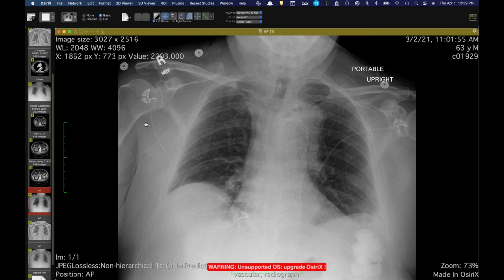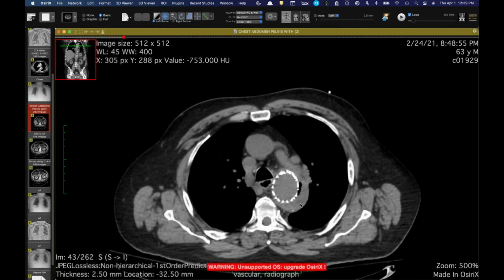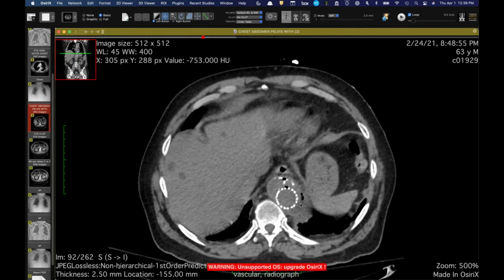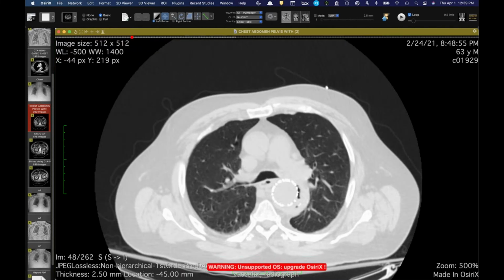And this was the follow-up radiograph, and in between, we did a couple of CTs. But you can see this thing is chronically thrombosed. There was never filling of this false lumen, which is kind of interesting on its own. But they had gotten a good proximal seal. But there's just gas throughout the excluded portion of his dissection.